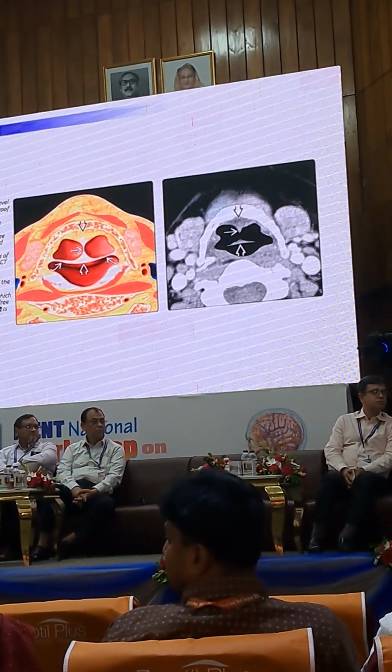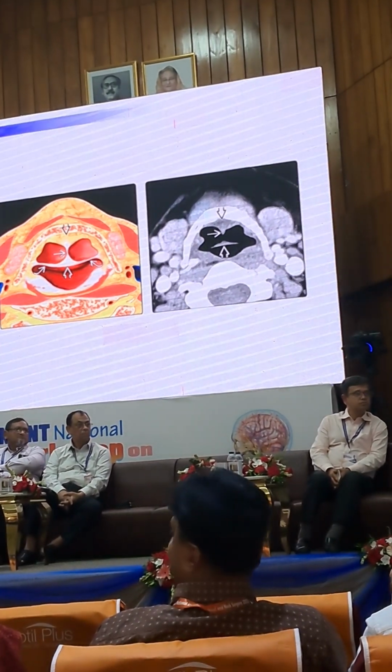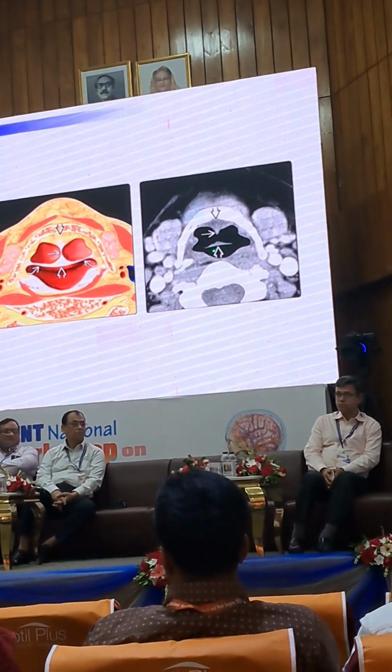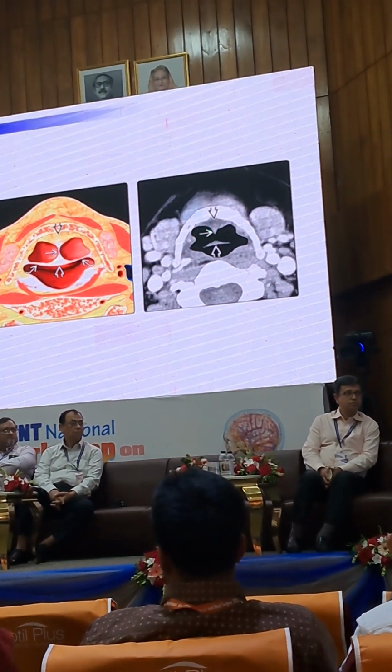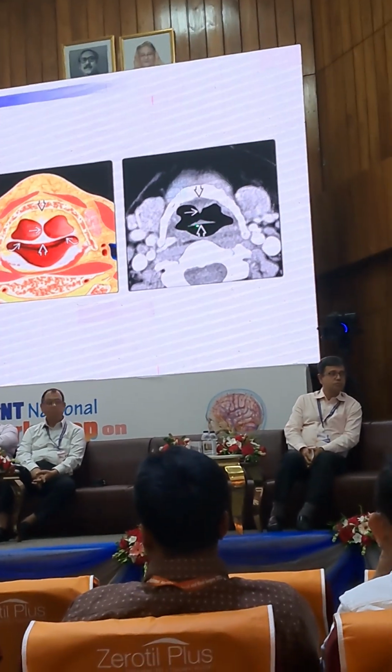These are the vallecula, and same in the CT scan. The epiglottis, median glossoepiglottic fold, pre-epiglottic space. This is the epiglottis. This is the midline structure, median glossoepiglottic fold. This is the epiglottis, free margin, supraglottic.